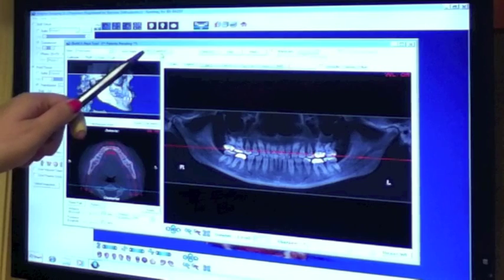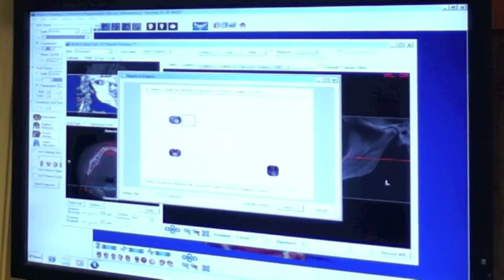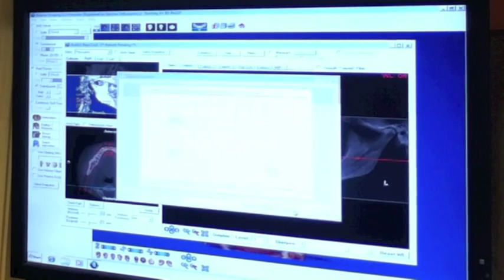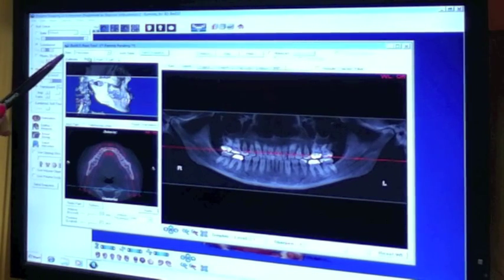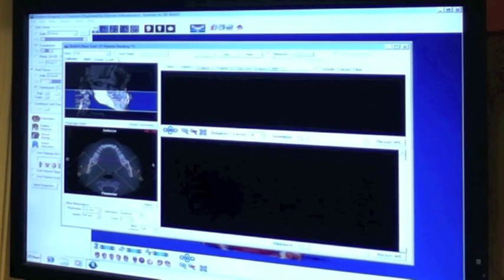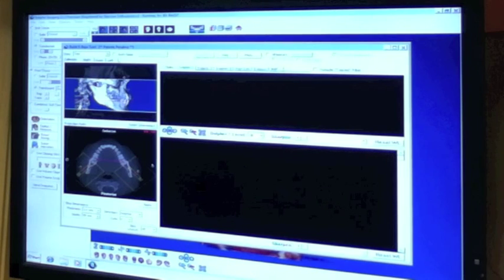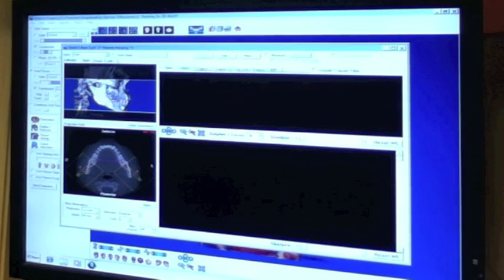And then send snapshot, save to Dolphin layout, and this also goes to the correct location, third row down in the second box over. You'll change your view again to the TMJ. This you'll adjust the white bar to right at the bottom of the eye socket.